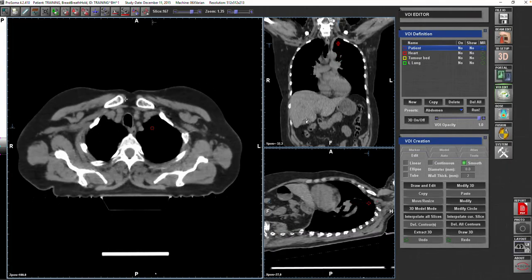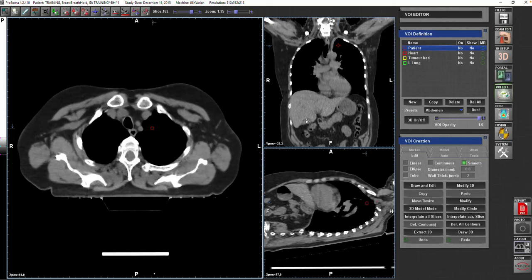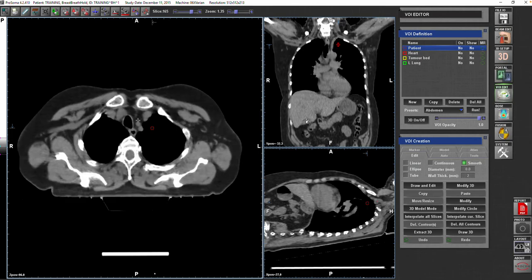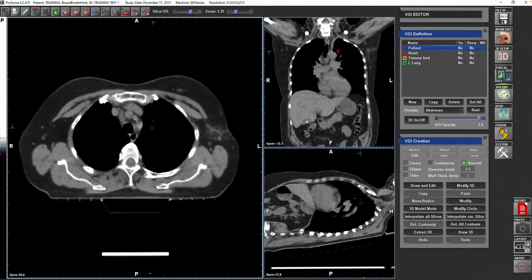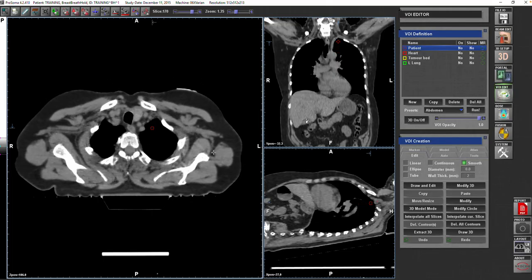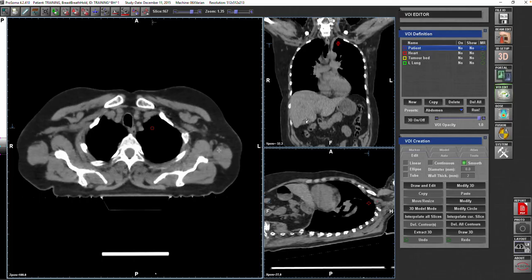I would recommend that the first time you are using these scans, try to use diagnostic scans, and try to use one with IV contrast, not like this one, because the IV contrast will make your life much easier. The second point I want you to be aware of, because you will read it inside the guidelines, is something called the thoracodorsal vessels.